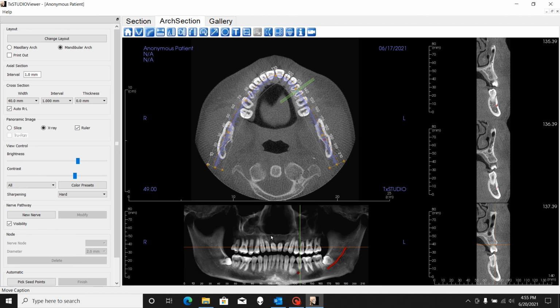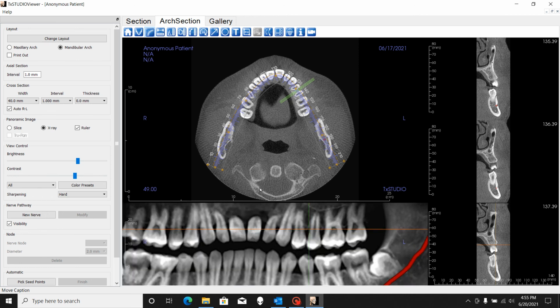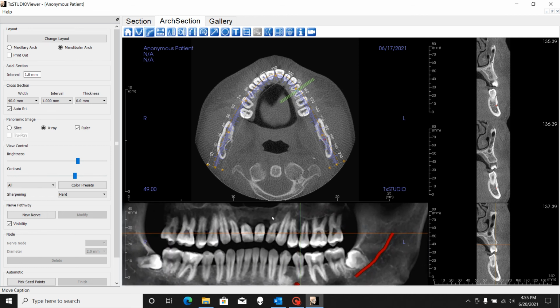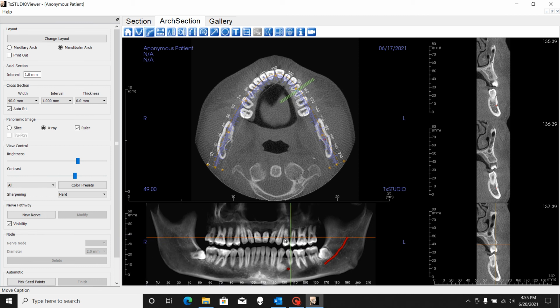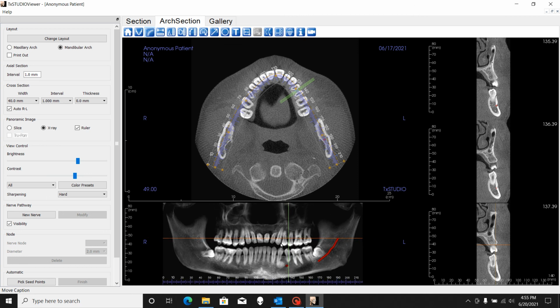I kind of think of it as allows me to shift it around. If I want to have control of how big or small the picture is there, I would hold control and my left mouse, and I can make it smaller or bigger to kind of hone in on an area. So I want a lot of control on how big or small it is, so I use control and my left mouse for that particular shortcut.